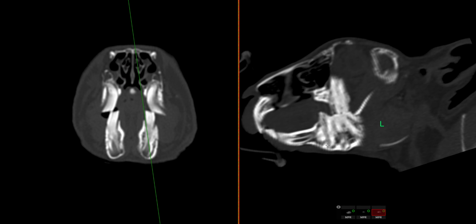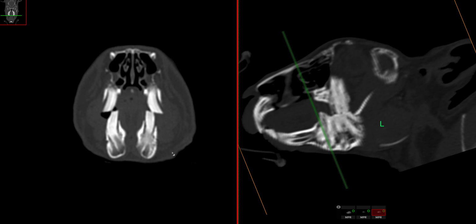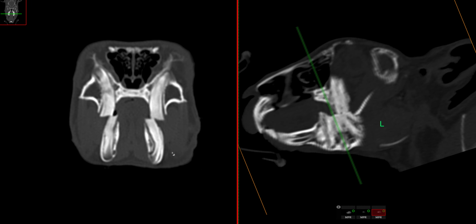And on the opposite side, on the left side as well, we can see two small bulges, and we can see that the cortex of the mandible has decreased in width. So in this case, we cannot talk about osteolysis. I think this is more atrophy due to mechanical pressure of the growth of the reserve crown. You can see also that this tooth is slightly bent due to the pressure.